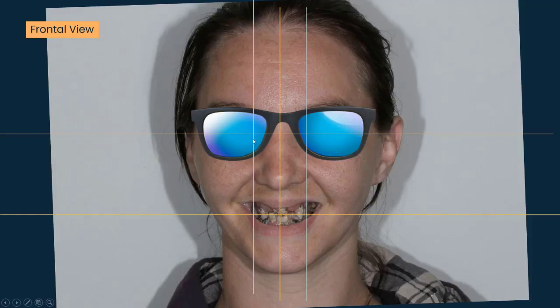And then these two vertical lines, those are just what I'll adjust to the width of the nose, because what we all learned in dentures, right? The teeth should be chosen and scaled based on that patient's facial type. And one of the best estimates of that is just to make the width of the anterior six match the width of their nose. If you do that, by and large, it's going to be appropriate for that patient.